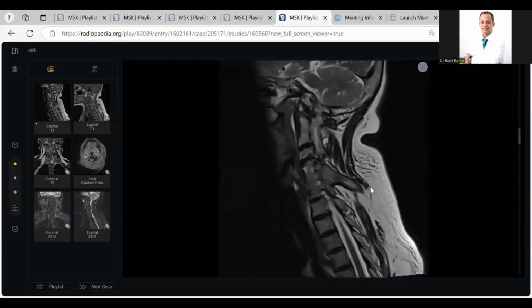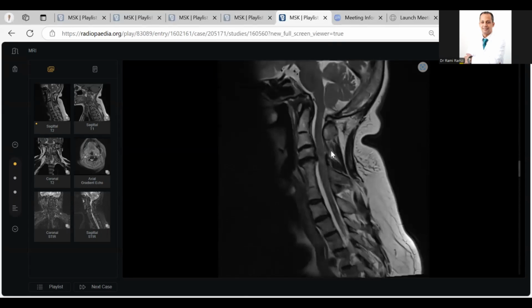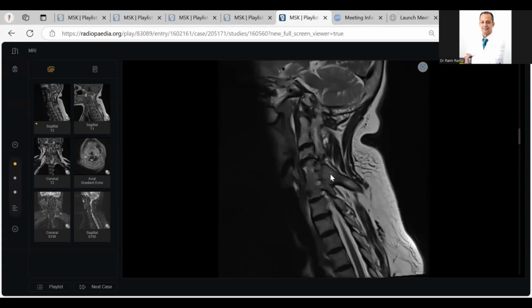What is this? This is an abnormally large posterior element. What is this? Fused posterior lamina of the conjoint vertebra. What's your differential diagnosis? So this is a vertebral anomaly that is resulting in myelopathy, with the myelopathy almost due to this disc. There are C2, 3, 4, 5 discs. Don't worry about it.